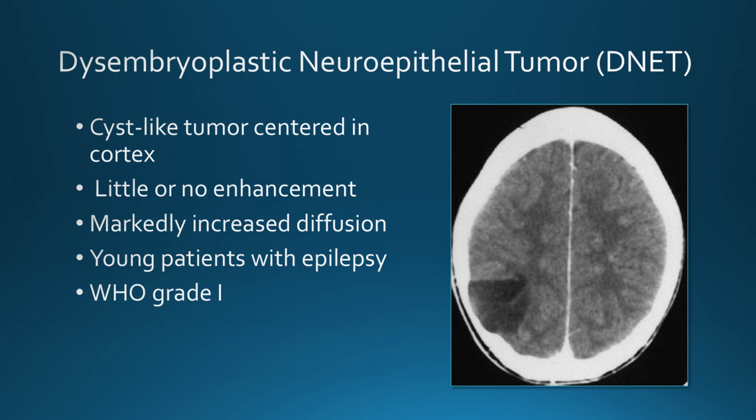Young patients typically present with long-standing epilepsy. This one here, you can see it has remodeled the bone adjacent to it, and these are WHO grade 1.